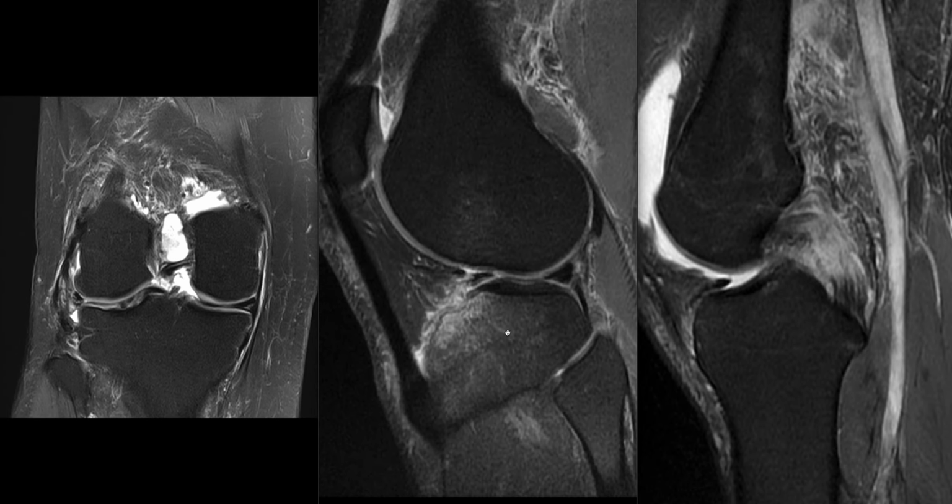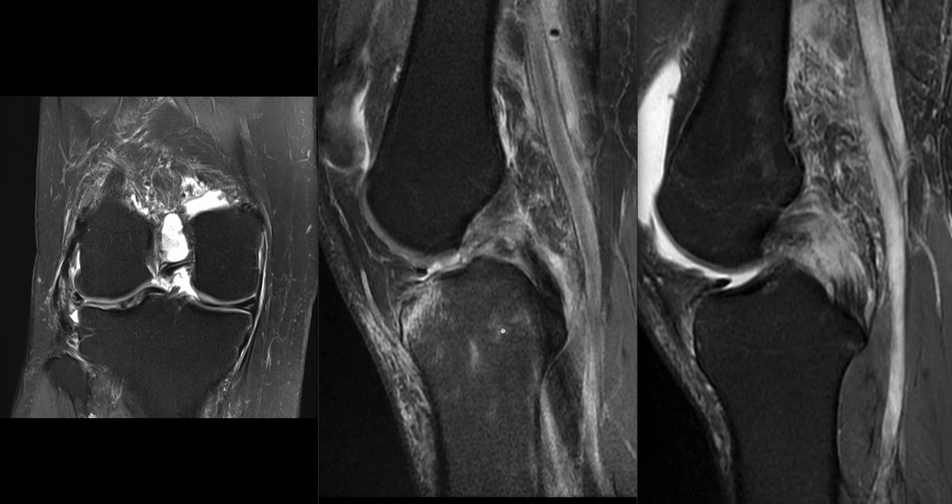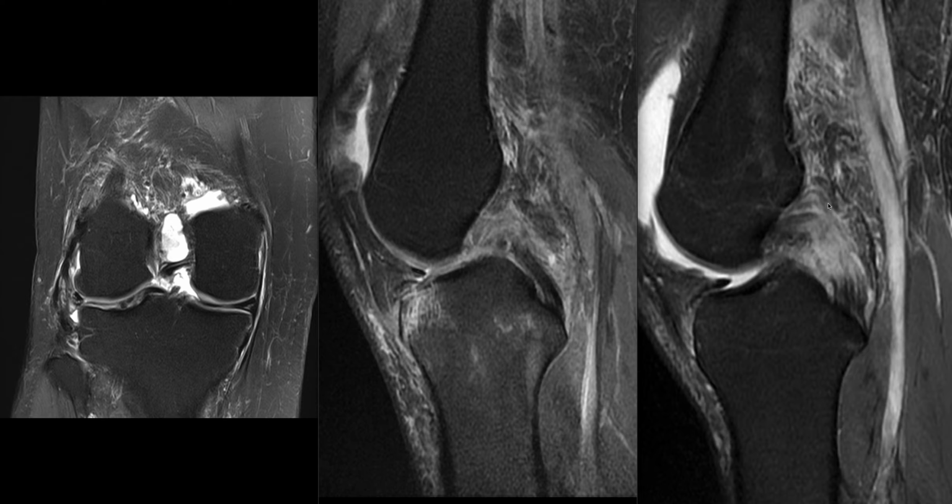And here it's easy to appreciate how these two bone surfaces have compressed together and that this is a hyperextension injury. When you have hyperextension injuries, it's also important to appreciate that you can get other tears of the posterior capsule. And you can see here that there's quite a lot of hemorrhage in the popliteal fossa in both of these patients. And that would certainly be consistent with an associated tear of the posterior capsule.